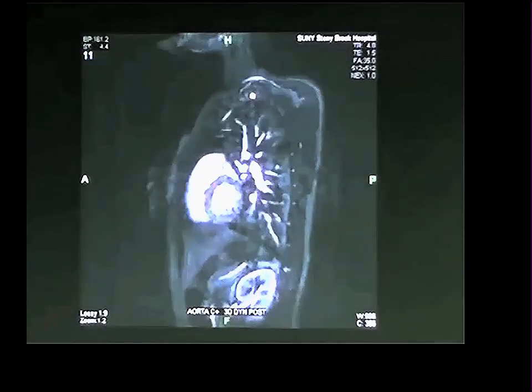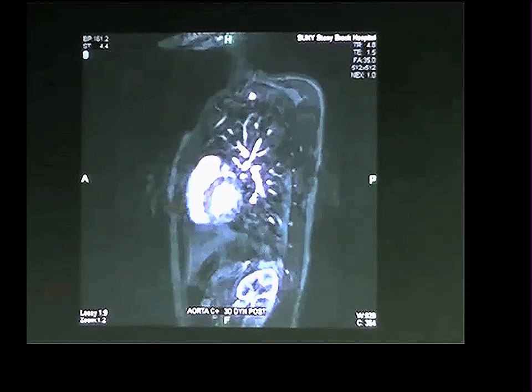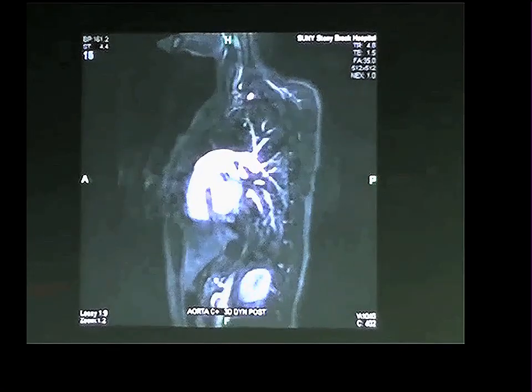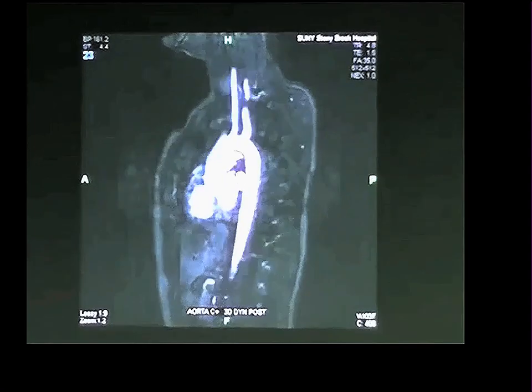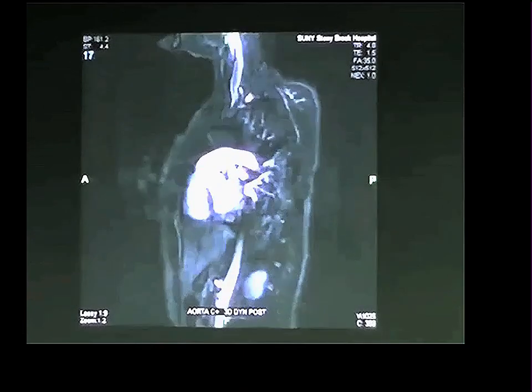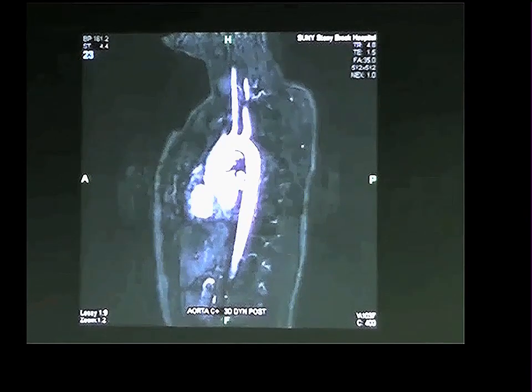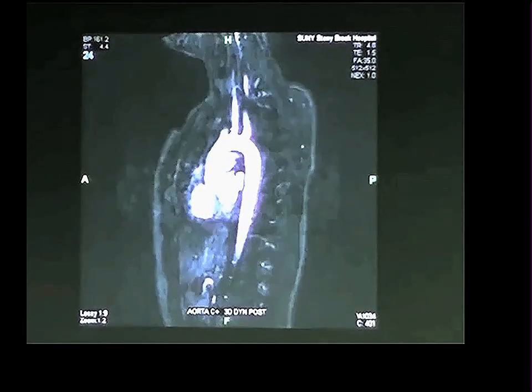And this is just a sagittal section of the same magnetic resonance angiogram. Again, if anybody shows you a sagittal section of the heart in imaging, the anterior chamber is the right ventricle. That's it. If you don't remember anything else, remember the anterior chamber is the right ventricle. So that's what this thing is here. All right. And here we see giving rise to the pulmonary trunk, and we see the bifurcation. And we go to the left ventricle, which is this one here. Here it's giving rise to aortic valve, ascending aorta, arch of aorta, brachiocephalic artery, left common carotid artery, left subclavian artery, in sequence.